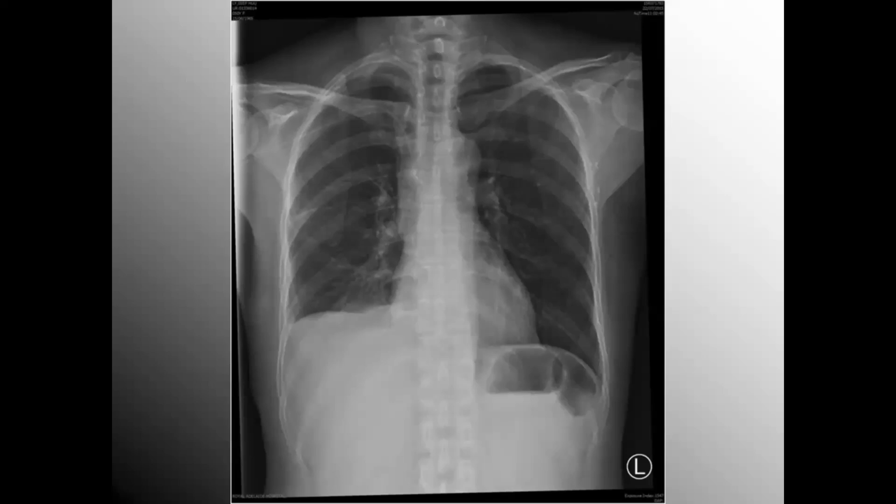And you say, what's the concern that we know where T1 lies? Well, if you're one of those clinicians documenting the depth of insertion of the ET tube at a certain thoracic vertebra, this is very helpful. So the widest transverse process, there's T1, 2, 3, 4, and as we mentioned, right around T4, T5 every time, there's where the adult carina can be found.